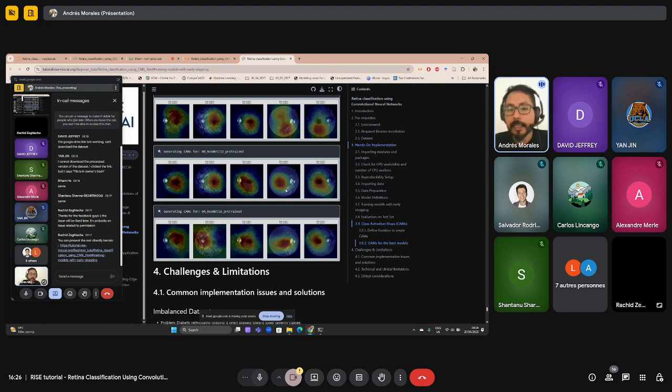Yeah. So the idea of these CAMs, the class activation maps, is that you could try to understand a bit more what the algorithm is doing, and this will also help if you go to real world applications. So probably a clinician will not blindly trust the algorithm because it can have errors, as you have seen. But if you have the classification plus the algorithm tells you, okay, I'm classifying this because according to the model, this part of the region is important for the classification, the clinician could go double check and ensure that actually what the algorithm does is proper.